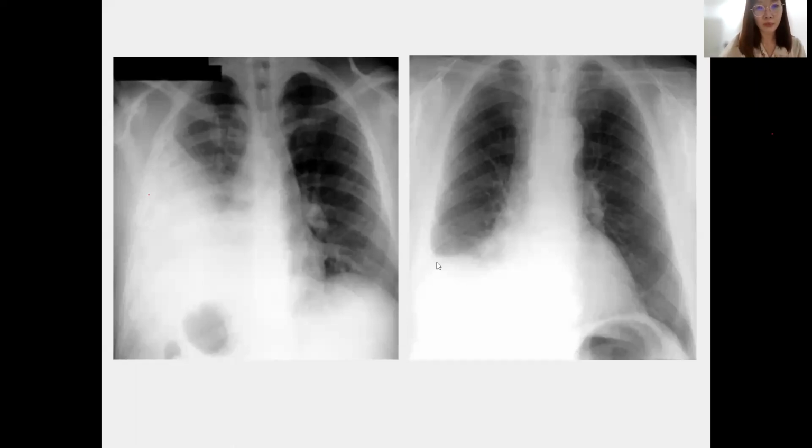So no one should miss a pleural effusion, but sometimes it is a bit difficult and tricky where there's slight blunting of the costophrenic angle in a normal person. I always encounter that as well. So sometimes, if the rest of the lung fields are clear and the patient is asymptomatic, it might be due to pleural thickening. Sometimes when they do the X-ray, they're not taking a deep enough breath. Sometimes the costophrenic angle will be slightly blunted as well, I noticed.